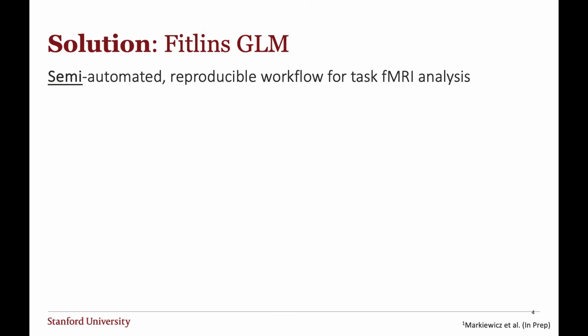And so we developed this semi-automated workflow. It's not completely automated because it is important to have a user involved throughout, particularly in the early stage when a model and a spec file, which I'll discuss later, isn't established yet and provided. It's intended to be a very reproducible workflow, so you can just simply download the data, run it end to end, share it, and someone else could do the same thing. All they need is to learn a couple of command lines.